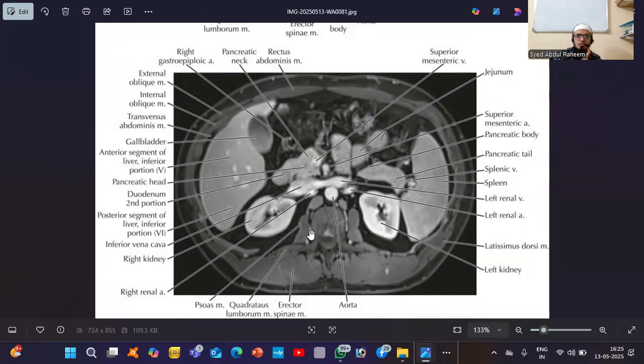This is MRI. So there's the reason here it is in dark color, gray color. The bone is in gray color. Again, ribs are also in gray color. Here you have, this is the spleen, this is kidney, both are kidney. This is the pancreatic neck. Okay, arteries, veins, everything you can see in this.